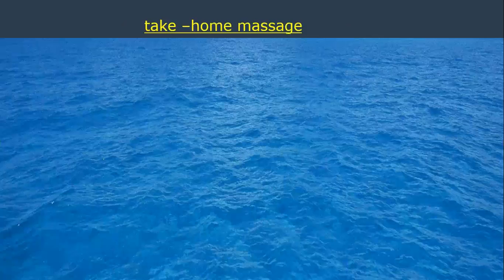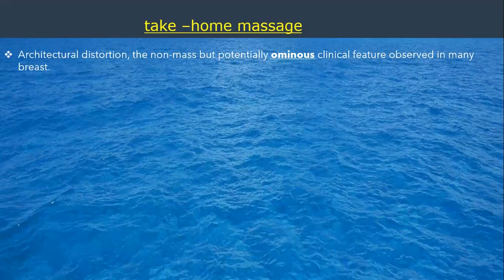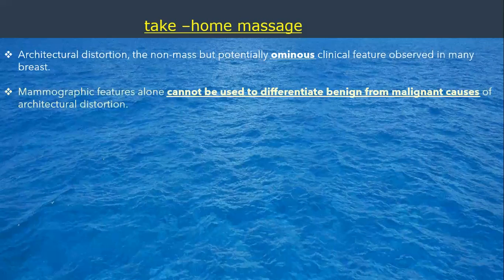So, take home message: architectural distortion is a non-mass but potentially ominous clinical feature observed in many breasts. Mammographic features cannot be used to differentiate benign from malignant causes of architectural distortion. Causes simulate breast cancer very closely, such as fat necrosis, and at the same time cancer might simulate radial scar and so forth.